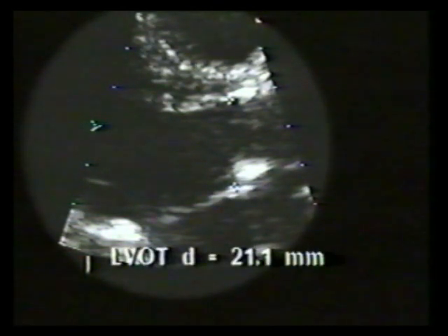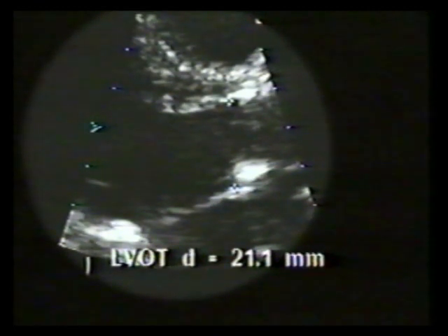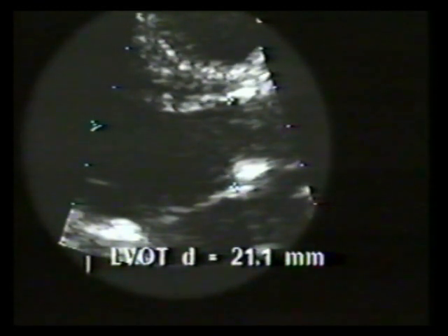A systolic frame has been selected. One cursor was placed at the junction of the sewing ring with the ventricular septum, and the second cursor has been placed at the junction of the sewing ring with the anterior mitral leaflet. The LVOT diameter is 21.1 millimeters. This is essentially the same as the external diameter of the sewing ring.